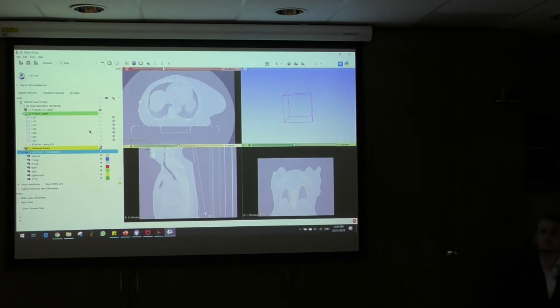Yeah. So what I have done is when I used that option, I have two tissues. Let's say one is dense tissue and another one is soft tissue. Yep. So it recreated the 3D model with different coloring. But then when I export that file into STL, I have two separate files. Yes, you would. Merging together.